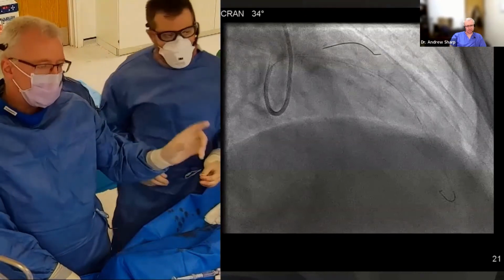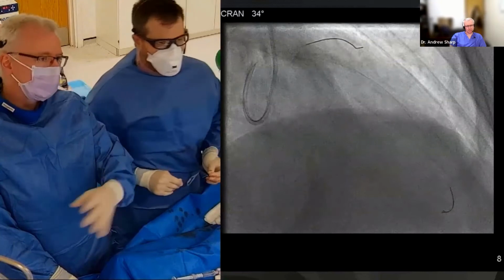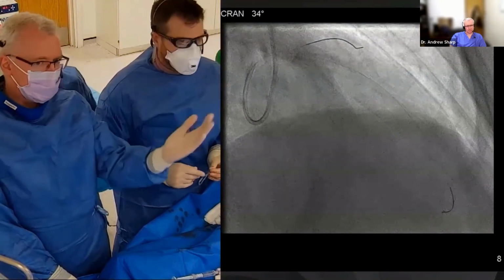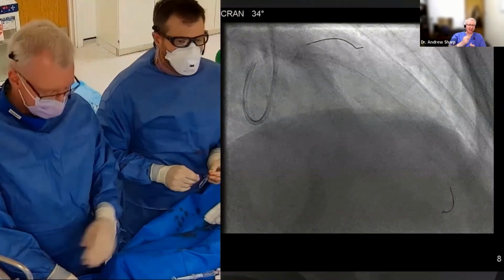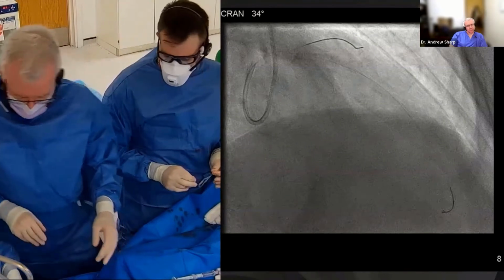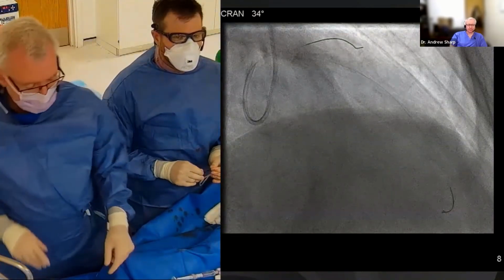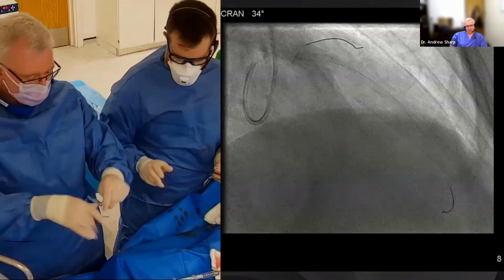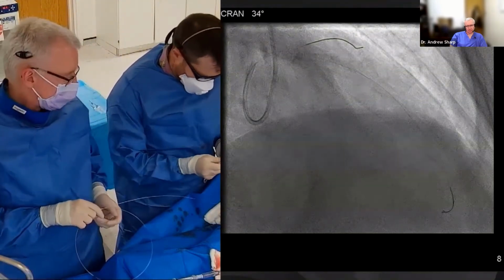38, sorry. So there's no question that our distal reference is not giving us the same information for the distal part of the stent as the proximal, because we're going across into a 4.25, 4.5 millimeter vessel. So there's a couple of ways we can handle this. We can segment the stent into 2 and just treat them almost as 2 independent stents and try and get expansion more than 90% of the distal reference of each segment.